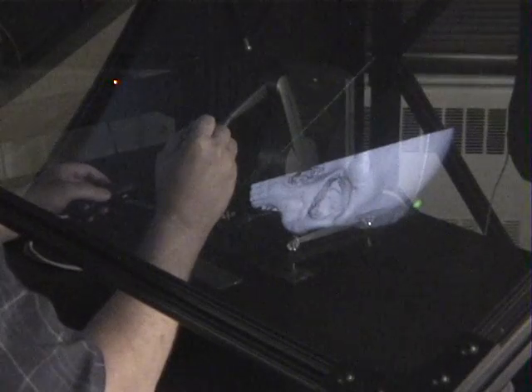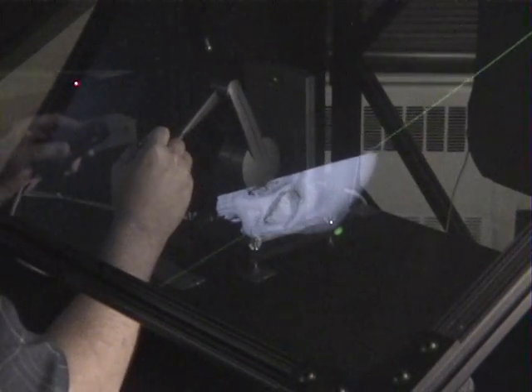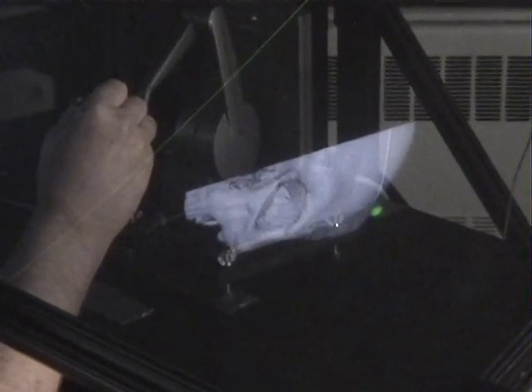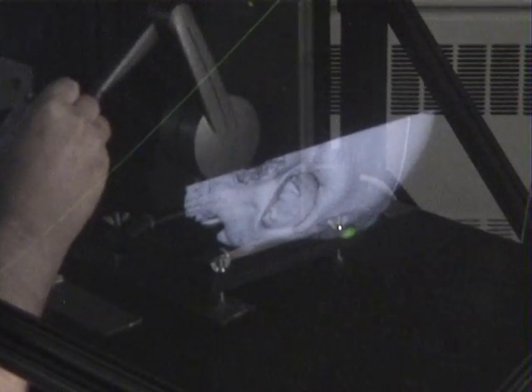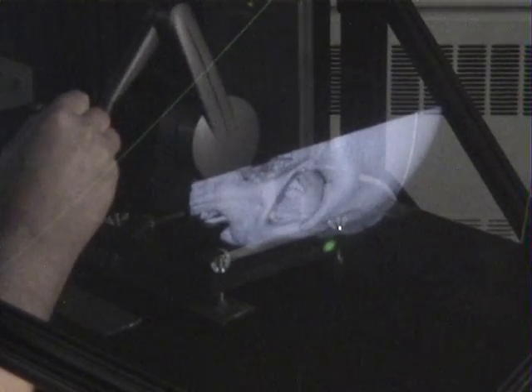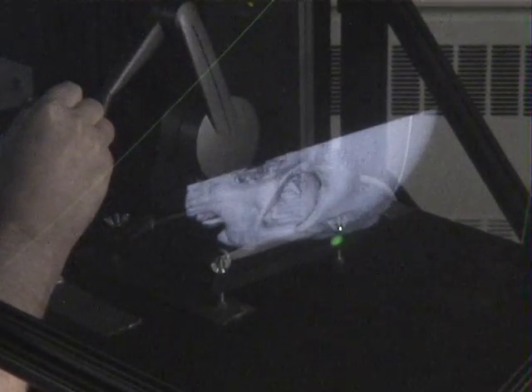and just position it a little bit. And now I can feel the edge of that clay, and I know that's more than I need, so by pressing the button once again, it acts very similar to a Dremel tool with the burr in it, and I have the sensation of grinding away the excess material.